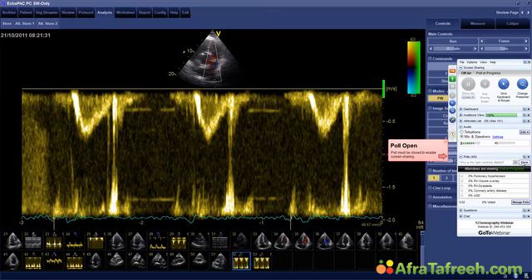Why is the right ventricle dilated? Is it because the patient has severe pulmonary hypertension? Well, this could maybe explain his fatigue. Or does he have right ventricular volume overload? It should be overload, not overlay.